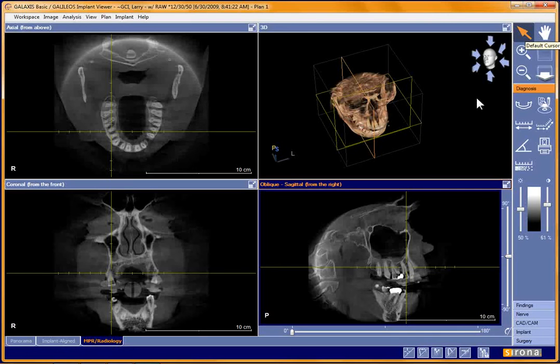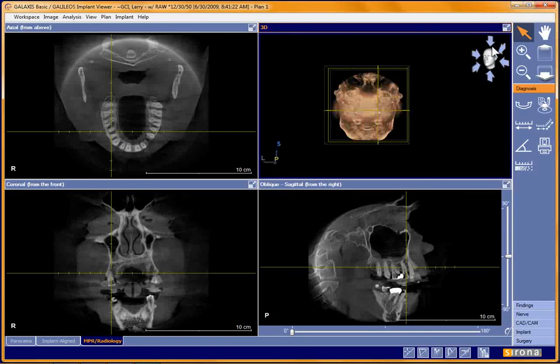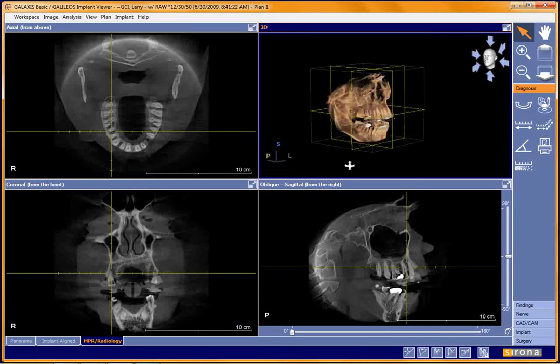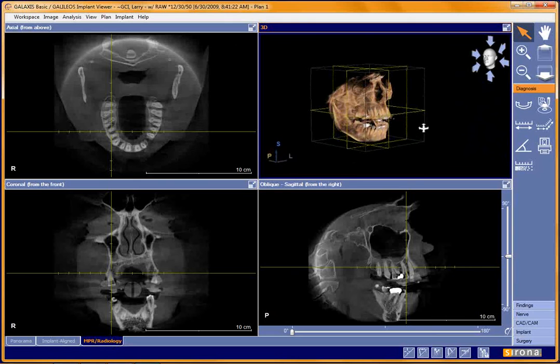Now, one other thing that we could do within this 3D view, which we'll look at a little bit closer in a later class, but one of the easier things is to quickly, with these little arrows, change our views just by clicking those, and you don't have to grab a hold and roll it around. Same thing down here. This gives you the orientation of where that is. You'd do the same thing here. And just like before, all of the same icons down here work in every window the same as they did as I showed you in the panoramic view at the beginning.